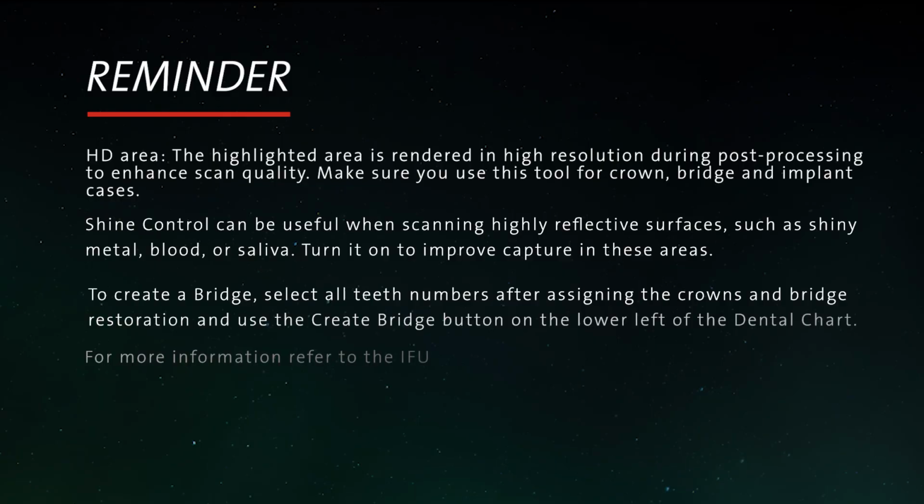To create a bridge, select all the tooth numbers after assigning the crowns and bridge restoration, and use the Create a Bridge button on the lower left side of the dental chart. For more information, refer to the IFU.